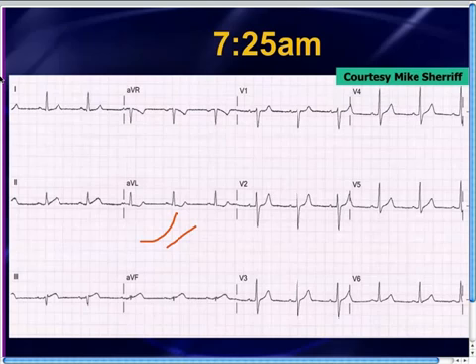We've talked about that on the EKG series, a weekly series, as well. When T waves start looking very straight, it's oftentimes an early marker of ischemia. So combining that AVL abnormality, the reciprocal changes in AVL, plus the straightening on the initial part of those T waves, Mike was right here able to diagnose an inferior wall STEMI, or confirm an inferior wall STEMI.